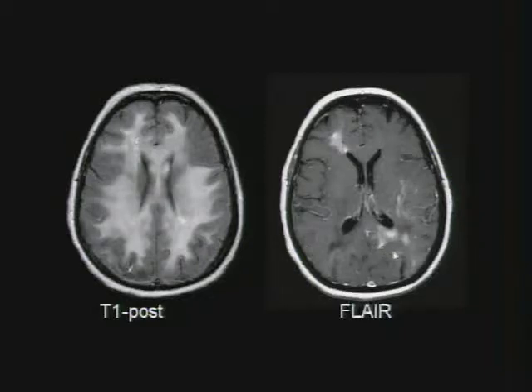Initially, this was called demyelinating disease, but this is actually B-cell lymphoma. A mimicker of all things, and also these tumors can be exquisitely sensitive to steroids, and in our experience, we have actually seen lymphomas almost completely disappear after 2 weeks of intense steroid therapy. No other tumor will do that. So when you see a lesion that completely disappears, think lymphoma, obviously think demyelinating lesion as well.